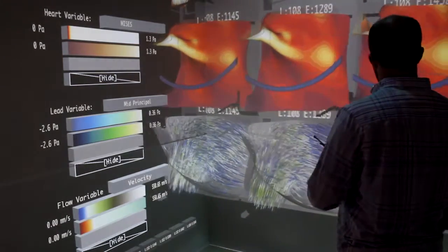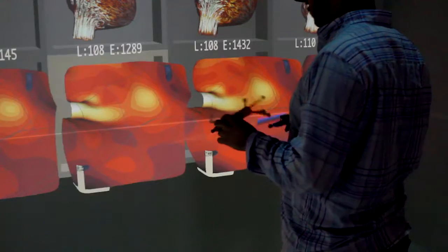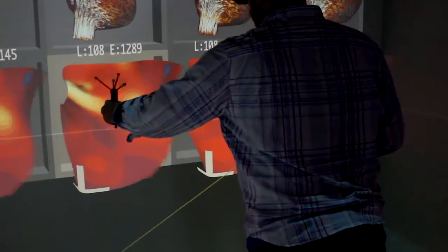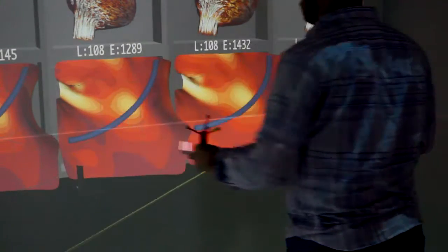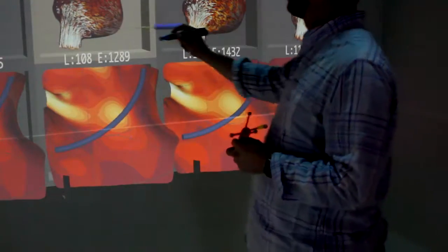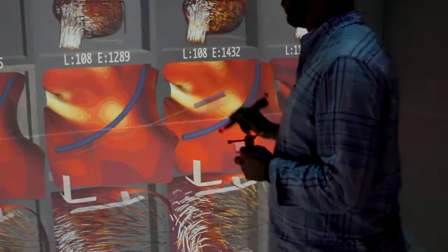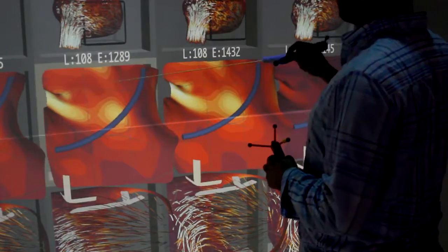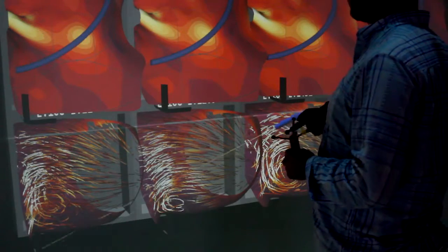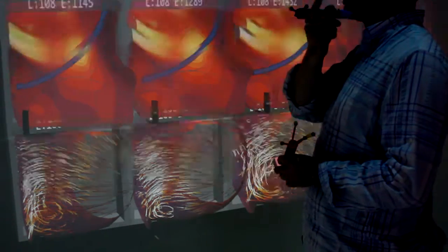The user interface is designed for 3D bimanual interaction. The non-dominant hand grabs and reframes the visualization, either individual views or the entire BentoBox widget. The dominant hand creates new subvolumes of interest when reaching into the data, or when standing back, it controls navigation. A click with a laser pointer zooms into a single view, or by sweeping out a selection, zooms into a larger portion of the BentoBox. Clicking the laser behind your head goes back.